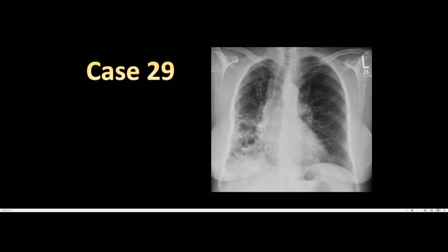You add all of this together, you think of bronchiectasis, which is often accompanied by interstitial fibrosis or interstitial lung disease. So, a case of bronchiectasis with a honeycomb appearance, so bronchiectasis with interstitial pulmonary fibrosis, because of the honeycomb appearance and because of the area of opacification, or the visible pulmonary markings surrounding the dilated bronchial airways. But everything else looks normal. Also, you can notice the trachea is deviated towards this region as well, again suggesting pulmonary fibrosis.